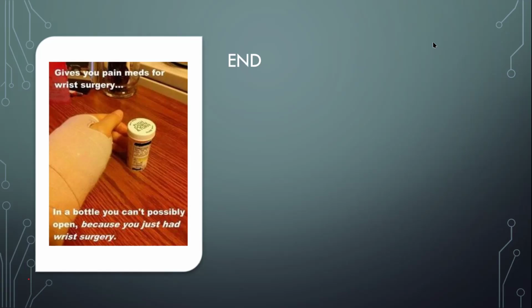Because what's going to happen is that if these patients are missed, do suffer any sort of arterial blockage, ligament injury, and you have missed it, there's actually very little that you can do to defend yourself based on the initial x-rays, because they will judge you based on what any doctor in your situation would do. So in other words, an emergency doctor working in an emergency department at any level would be expected to know how to read the lateral view of a wrist x-ray. Now, most of us don't. It's not something that's taught to everybody in universities for some reason, despite its importance.